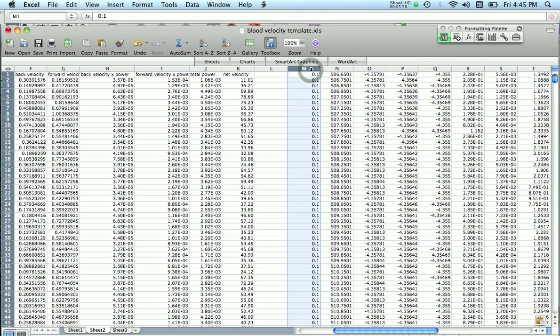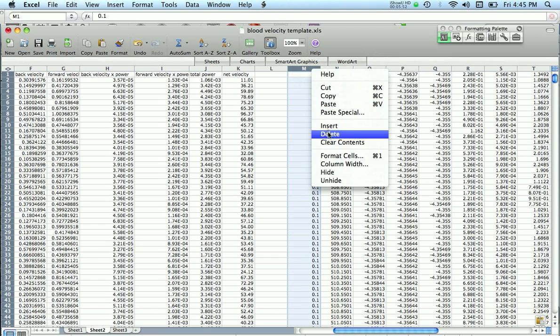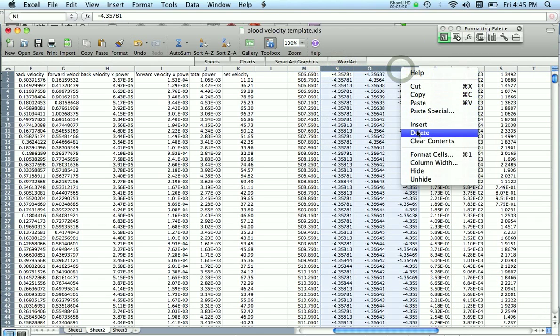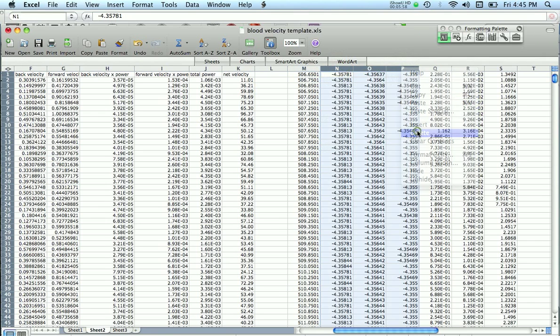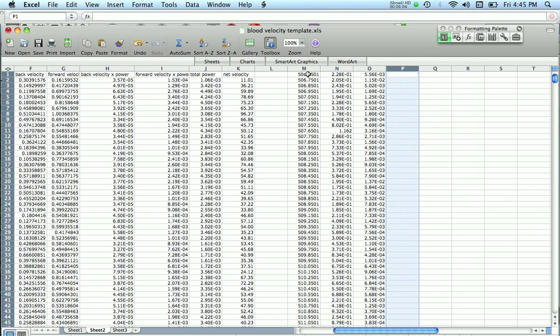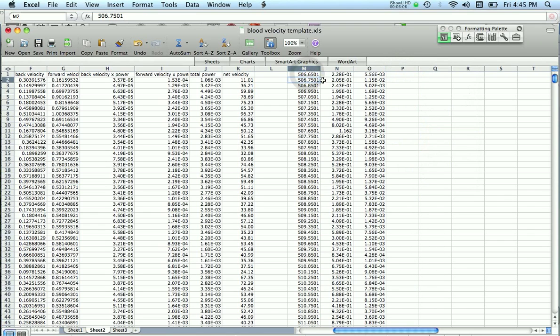This particular column is just the duration that you were selecting, which isn't important. These are related to tonometer values, which you're not taking measures of at that time, so they're not important. Finally, this value here is also not important. This is the amplitude. So what you have is time, and you can notice every 1/10 of a second that time goes up. You also have mean frequency, or the frequency power, and the power in that signal.